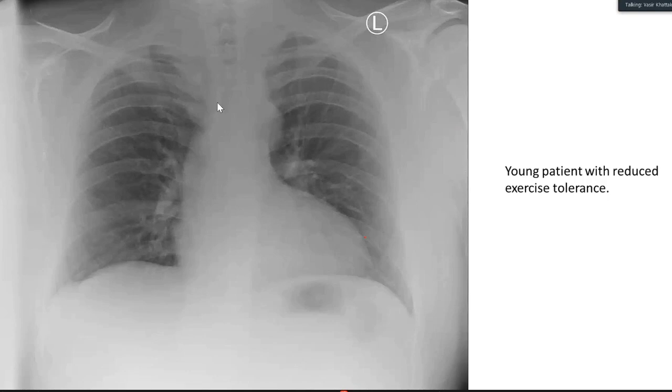And you must mention whether there is superior or inferior rib notching. This is for all the participants: when you say rib notching, you don't stop there. In this particular case, there is predominant, clear-cut inferior rib notching.